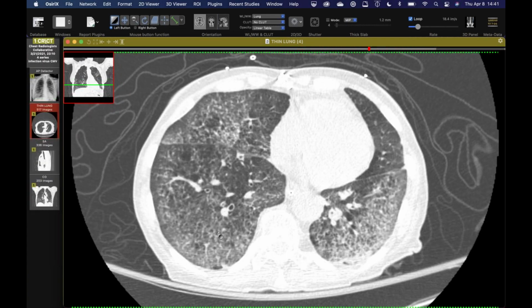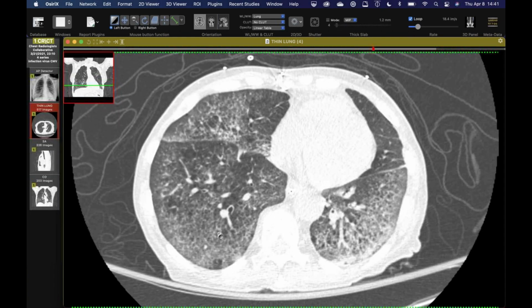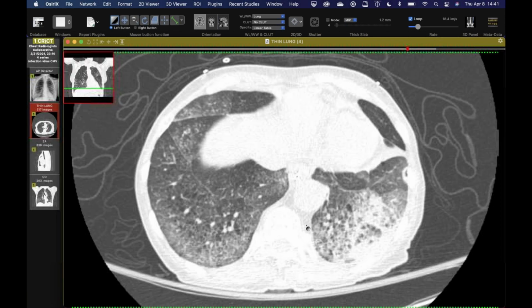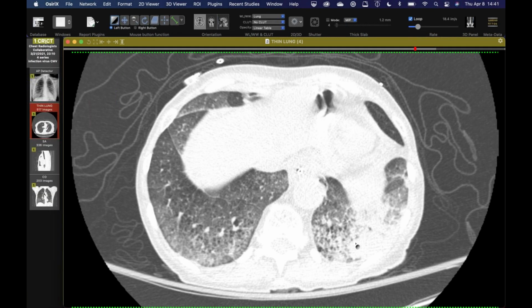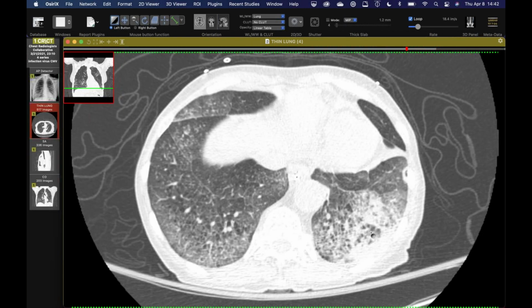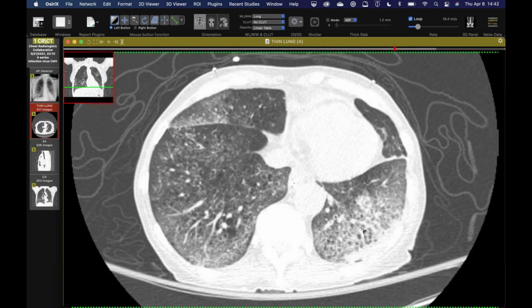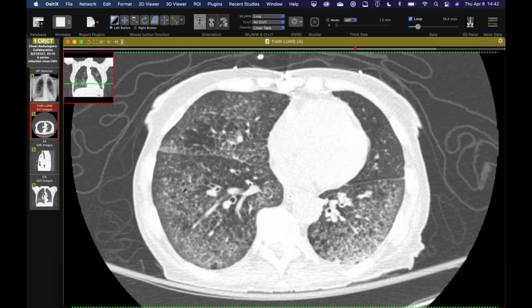So this patient had rip-roaring CMV viremia, and so the presumption is this is CMV in the lungs, which can present as small nodules. Interesting, the patient also grew out some aspergillus in the BAL. So I don't know if this is the aspergillus or not, or if it's one of those ones where they just find it, but there's really no imaging. I'd be happy with he may be aspirated, or this is just some stuff distal to that mucus plugging. There is some volume loss, or it could be. But I'm pretty confident that most of these tiny nodules fit with the CMV viremia.